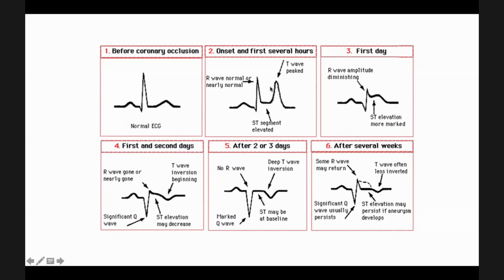If you see a patient with typical ischemic pain and tall T waves, you have to suspect this and repeat serial ECGs, because in the subsequent ECGs, after a few hours, the patient should develop ST elevations. Usually after 2 or 3 hours, the patient will develop ST segment elevations. A small Q is there in typical ST elevations.